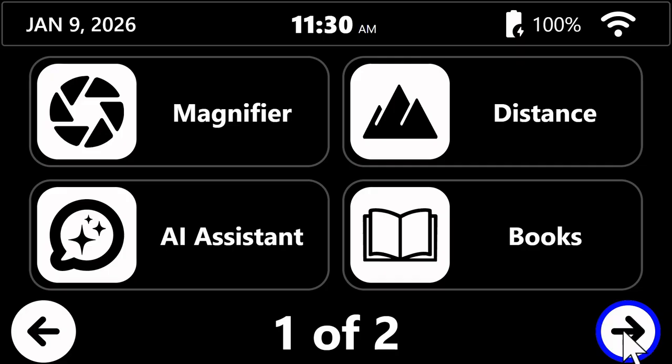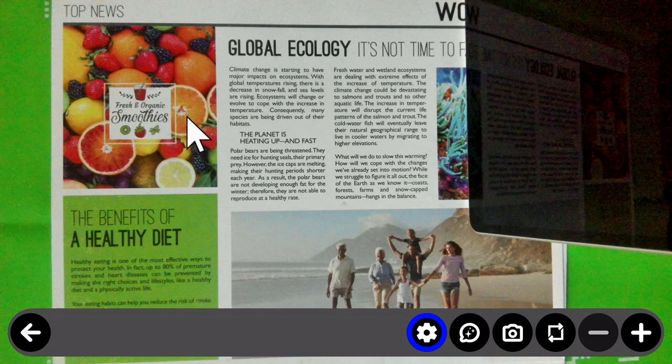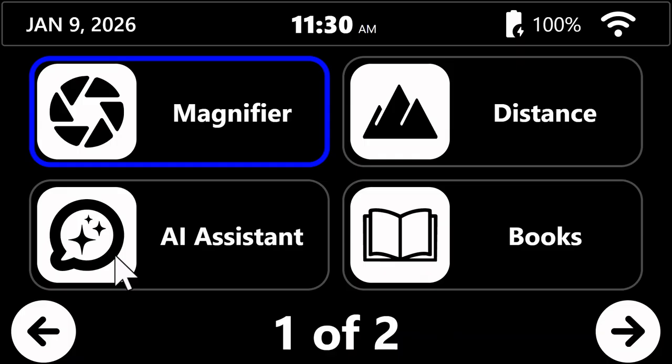Let's take a quick look within the magnifier application here. Oops, I have something in the way there that I'll move out of the way. And you will see that the toolbar is open and it is present at all times. In an auto or a hide mode, it would drop out of view, and there would be a little notch to the center that I just tap on to bring it back up each time I wanted to use it. But by default, I like to have it on for always because I'm demonstrating and I want to show all the functions that are available there. All of these other functionalities like the magnifier are covered in other videos.